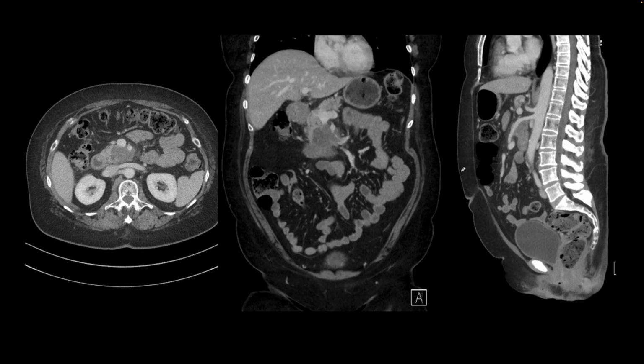This is our next patient. They were diagnosed with pancreatic adenocarcinoma. We have performed a CT of the abdomen and pelvis, and the tumor is right here, and it's abutting a portion of the portal vein and is encasing a part of the SMA that would make this tumor unresectable. That is also seen right here, the SMA being encased by this hypodense pancreatic tumor. Here's the tumor, and this is the encasement of the proximal SMA.